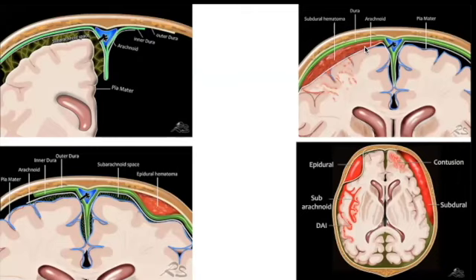Now, if you're looking at an epidural hematoma, which is the image that's about here, the epidural hematoma is just bleeding in the virtual space between the dura and the skull. So here's the skull, and this is a virtual space, which means that it doesn't exist normally. However, it is capable of existing whenever it needs to withhold fluid such as blood. So in cases of epidural hematoma, okay? And as I said, it should appear on an image as something that looks like a lemon, and we'll start looking at these images shortly, okay?